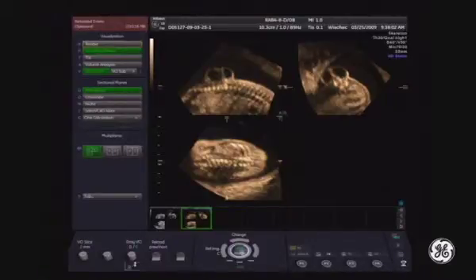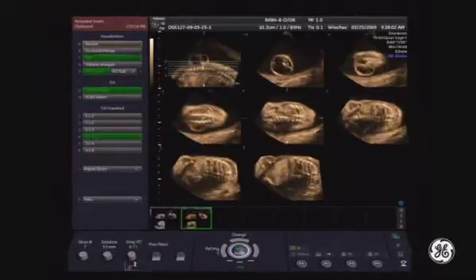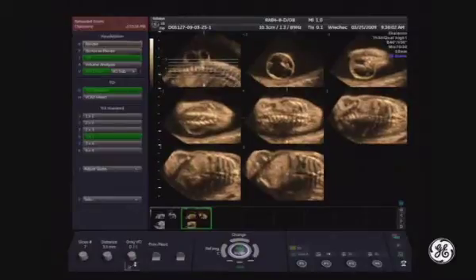Here we have access to tomographic imaging, and let's magnify it. And in the upper slices, you clearly see the spina bifida. Here you start seeing the ribs, but we need to be precise about the last pair of the ribs. So I will decrease the distance between the slices first.